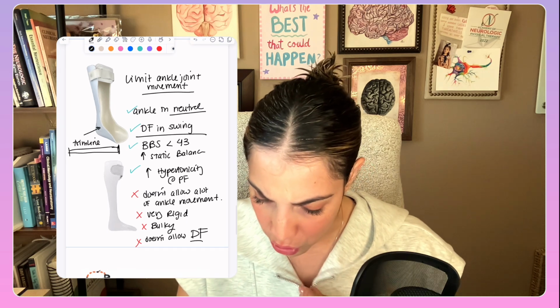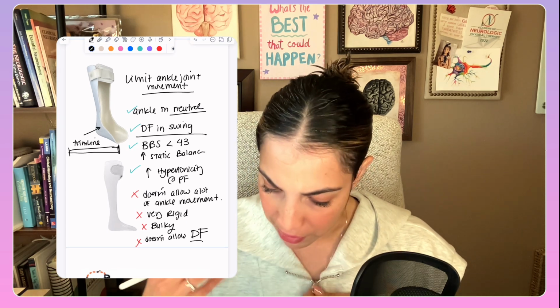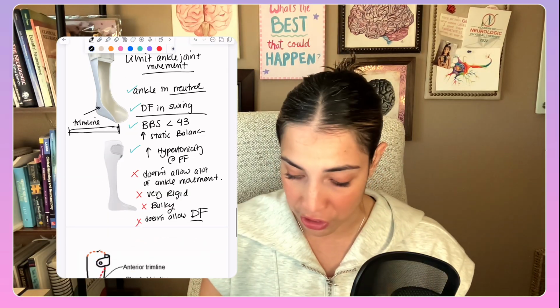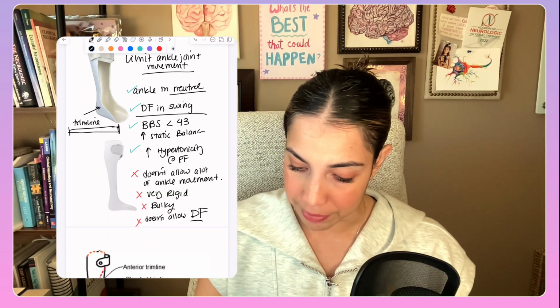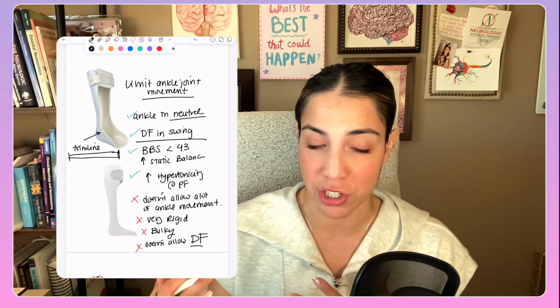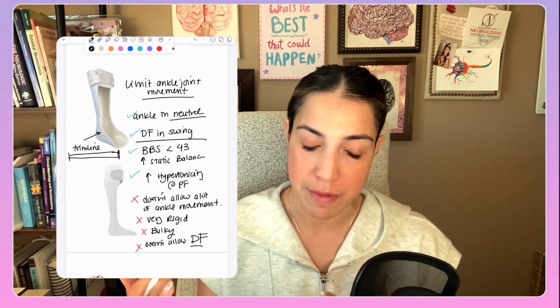The things that you need to consider is that this one is very rigid, doesn't allow a lot of ankle movement, doesn't allow a lot of dorsiflexion. So just consider those things. Maybe this is for someone who has a lot of plantar flexion spasticity.